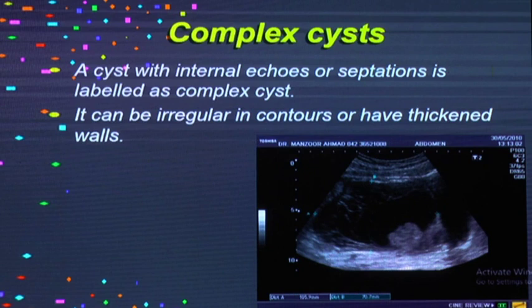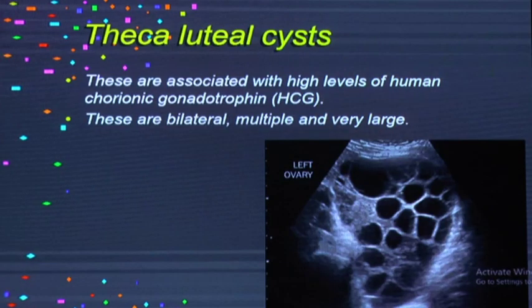This is a cystic area with post-enhancement, but the walls may be irregular and you see internal echoes or solid components. That is a complex ovarian cyst. And complex cysts may be non-neoplastic or neoplastic.